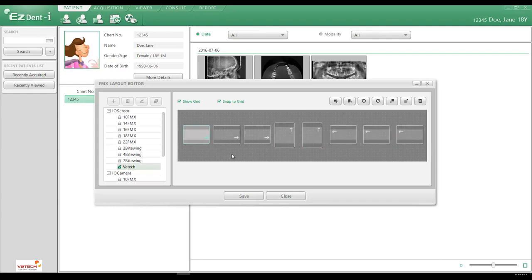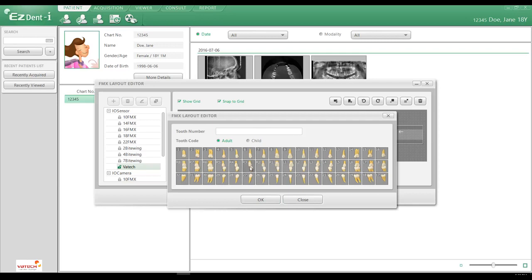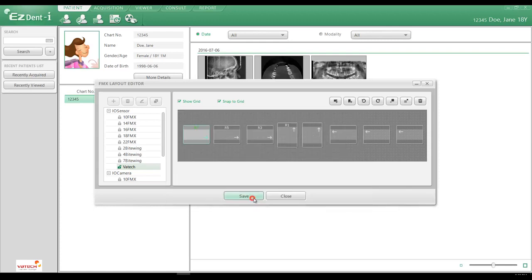And once you have everything set up, at that point in time we can go ahead and start defining our teeth numbers. We can either start from the right molar if we wish to, or we can also start from the central incisal area by double clicking. In this case here we'll do R1 for central incisor, double click again, and there's this one here for R3, the next one for R5, and then again for R7.